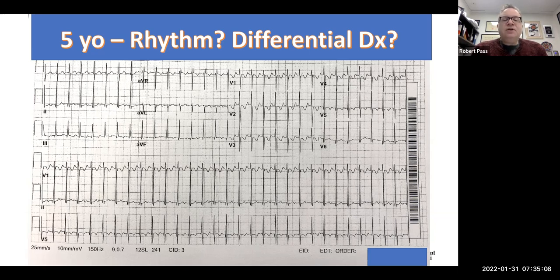But if you were to see a pause in tachycardia, it would be very suggestive that the patient does have PJRT. The only thing I would say is everything you said is 100% correct, Perna, but if you give adenosine to someone with EAT, occasionally some EATs will terminate with adenosine. So that rule makes it a little bit harder. In this particular case, this patient actually did have EAT, and this electrocardiogram was obtained in the recovery room prior to the ablation on that patient. And I think next week, we'll review that case and how we mapped and ablated this arrhythmia, which in fact was coming from the left atrium.